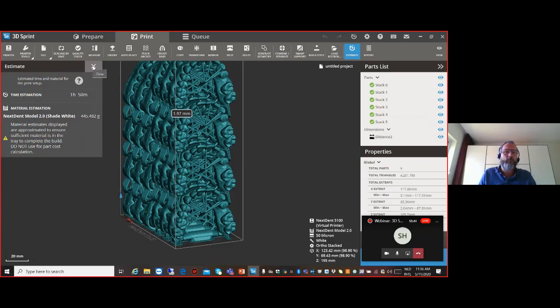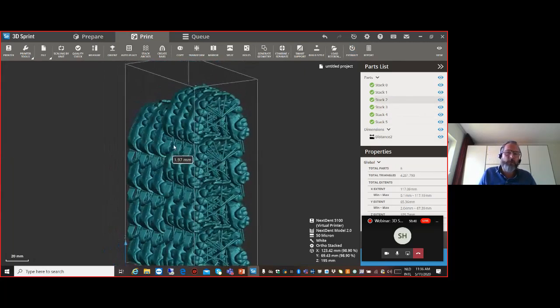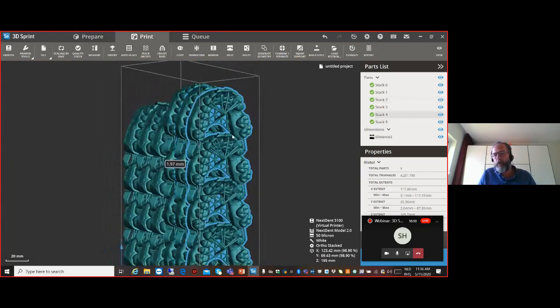And after the printing, and this is where Lars comes in again, you can very easily clean them, remove them, etc. So Lars, please show us how easy that is done. Okay, Lars. Yes, thank you, you're good to go.